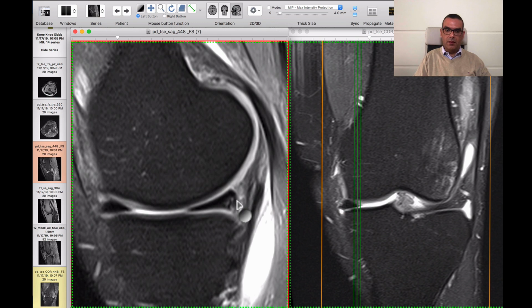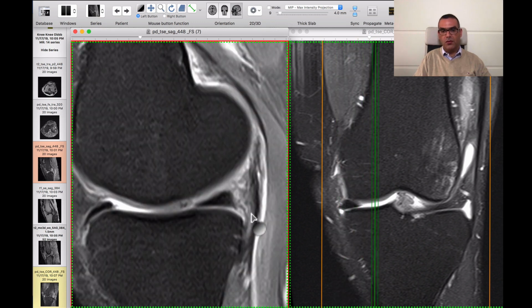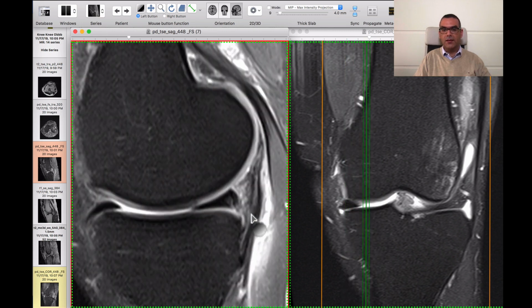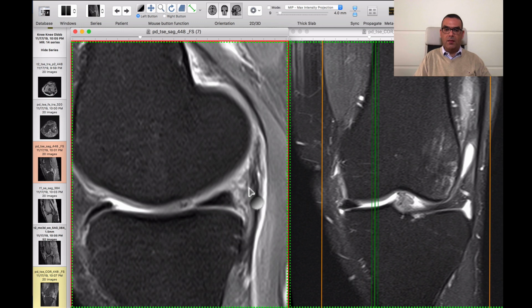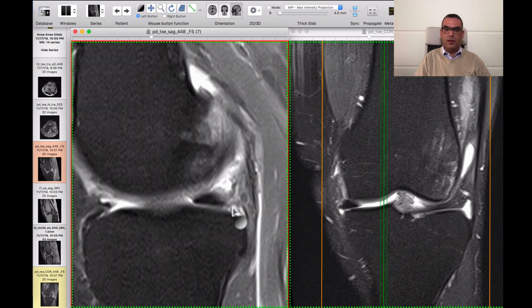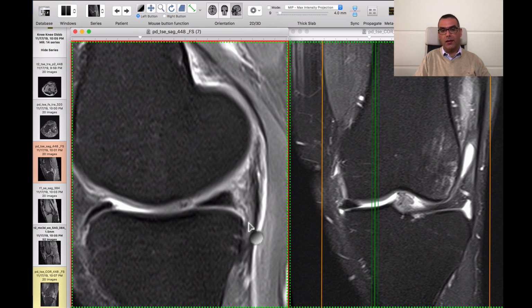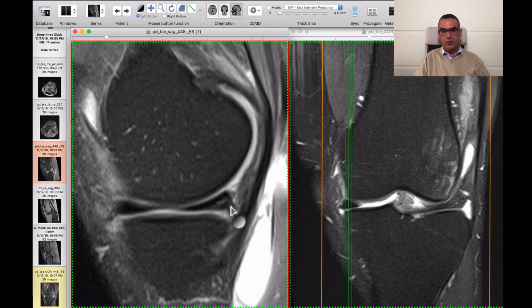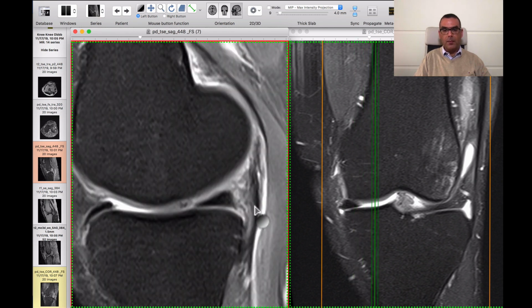This is the expected area of the menisco-capsular attachment we saw at the normal studies in the previous videos, and this is what a meniscocapsular tear would look like. So you see the meniscus is contused, there is a small peripheral vertical tear at the meniscal base reaching the inferior surface, and there is complete ill definition of the meniscocapsular attachment.